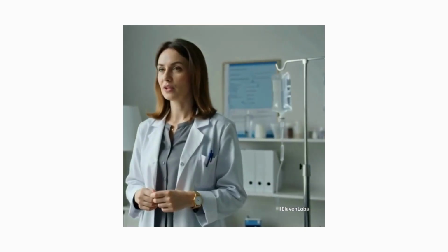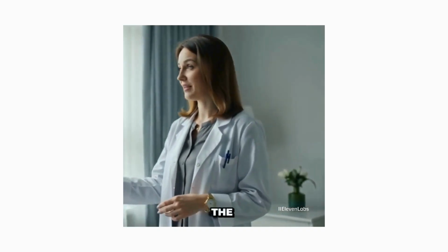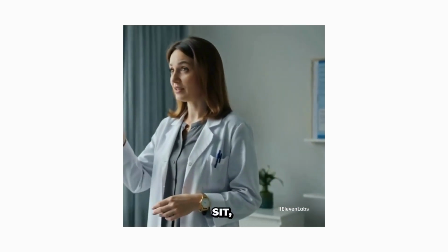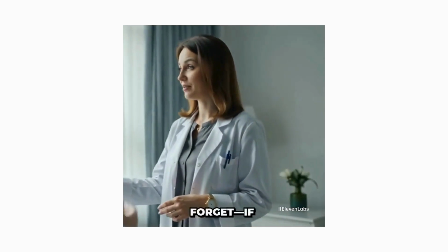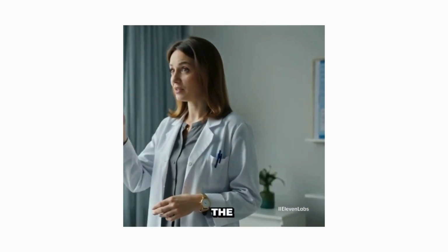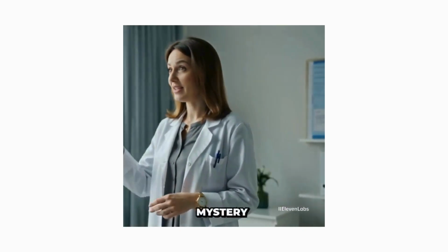Surgical planning. Always tell your neurosurgeon if the tumor is attached to the floor of the fourth ventricle. That's where the cranial nerve nuclei sit, making total resection much more dangerous. The spine. Never forget, if you suspect medulloblastoma, you must recommend imaging of the entire spine to look for drop metastases. Back to our mystery case.